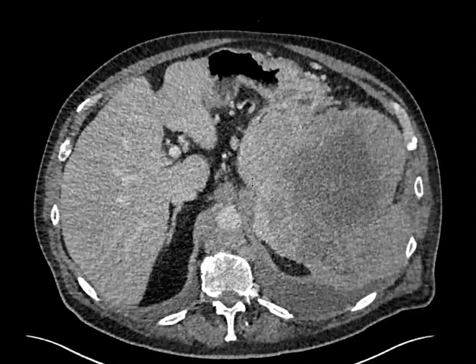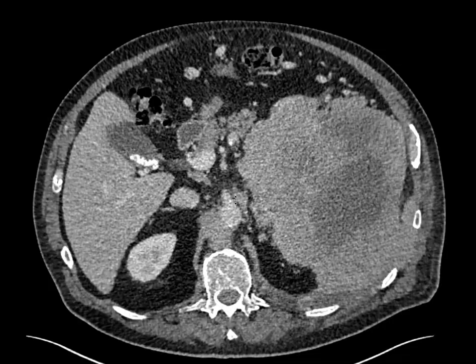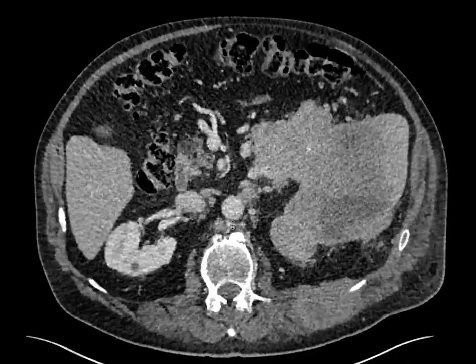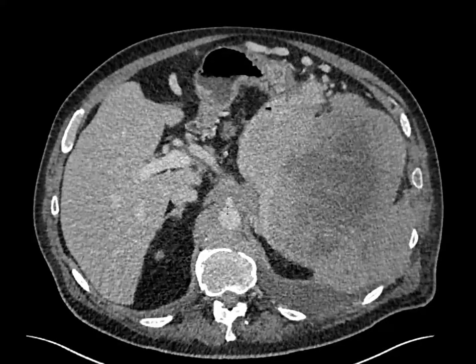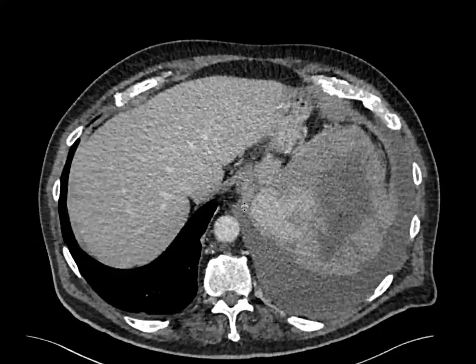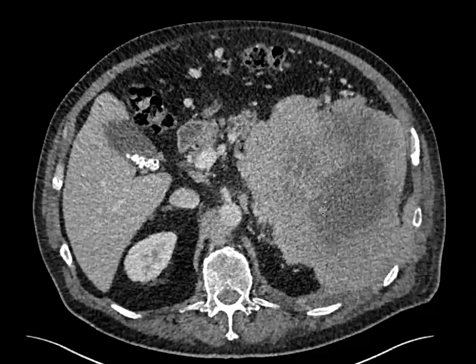In addition, you can actually see soft tissue encasement here around the celiac axis, and when we come down you can see some left periaortic lymphadenopathy as well as some lymphadenopathy around the crus of the diaphragm. And so this ended up being biopsied and was found to be a diffuse large B-cell lymphoma.